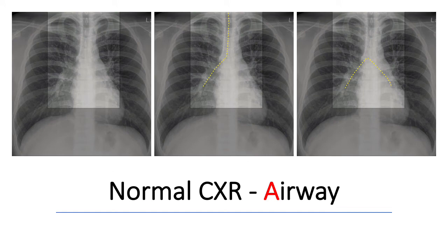First, we'll take a look at the airway. Trace down the trachea to the carina. Is it straight and midline? Is there any narrowing? Now you'll trace down both main bronchi. Is the carina wide or greater than 100 degrees? And is there bronchial narrowing or cutoff? Is there any inhaled foreign body?